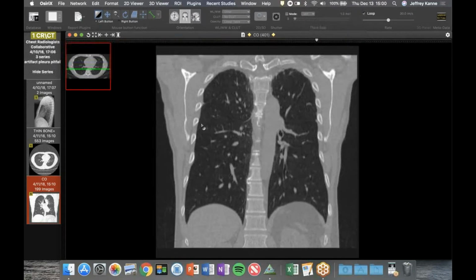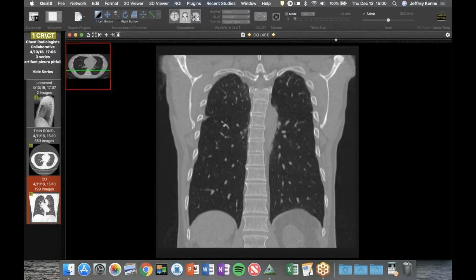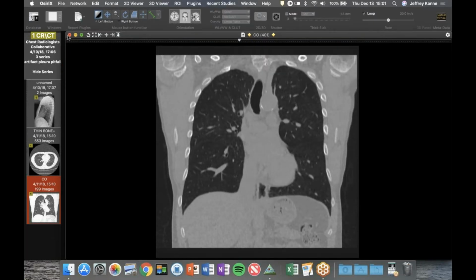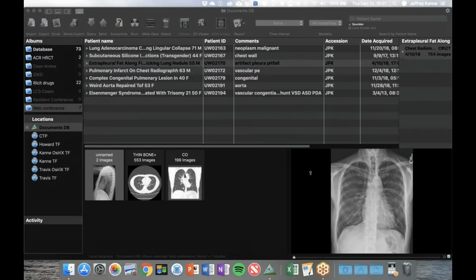Yeah, you can see it actually in two places. There's another area right there. Right. There's some weird accessory fissure here, which is just throwing everything for a loop. I hesitate to use the word suck because it has other connotations, but that really forcefully explains what's going on here. It gets sucked into the fissure.